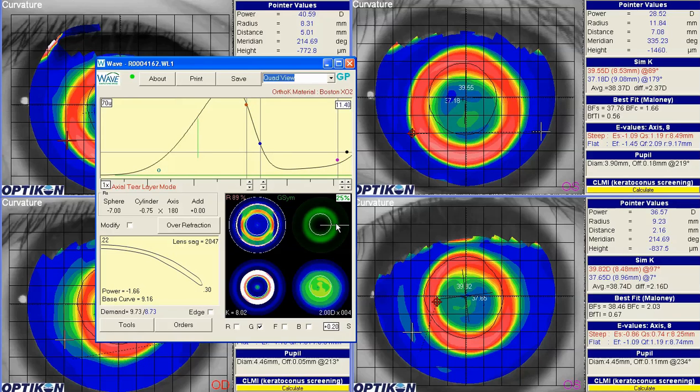All right, so now we're more uniform, but our topo demand again is a little bit too high. So this time back to 100%, and oops, going the wrong way.